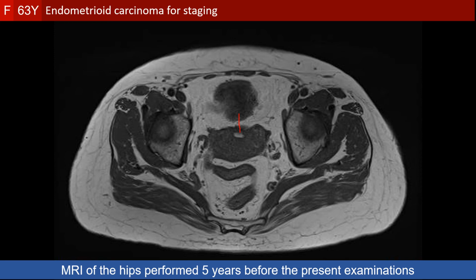So if this assumption is true, then we are dealing with endometrial carcinoma arising in endometriosis of a caesarean section scar inside the uterus. To verify, the patient was contacted and admitted having 3 caesarean sections, the last of them 20 years before the present time.